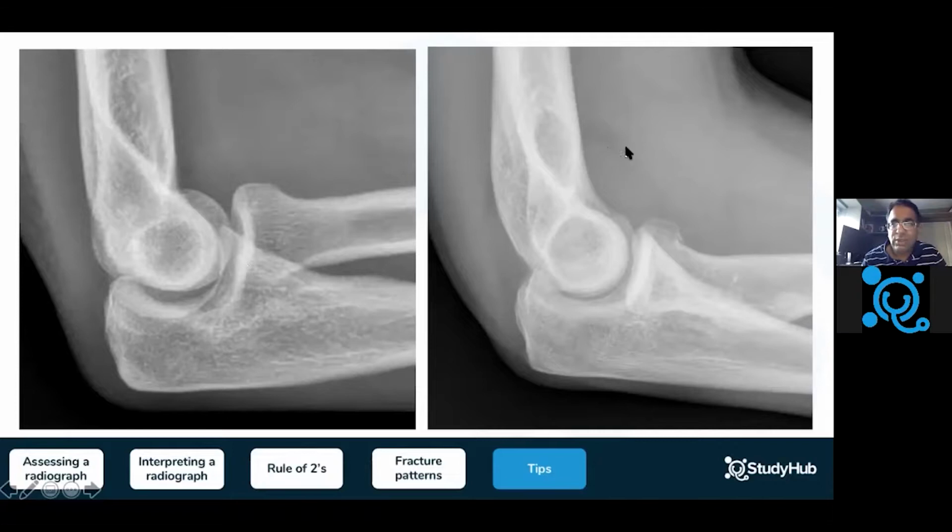Now, the first thing you will notice is here, this picture is a touch blurry, but it looks like there's a little bit of blackness there and more of the whitish gray beyond it. But over here, you see there is some sort of protrusion, like the black thing that you saw here is pushed out. Similarly, it looks more prominent on this side as well.